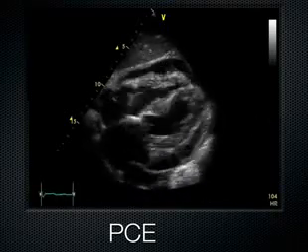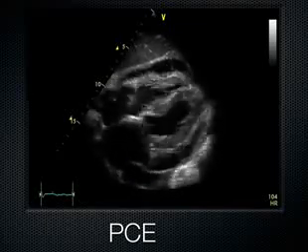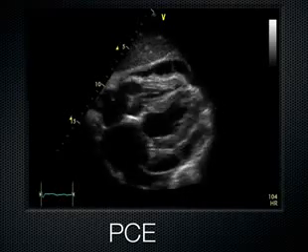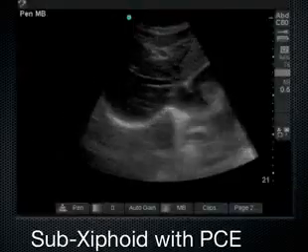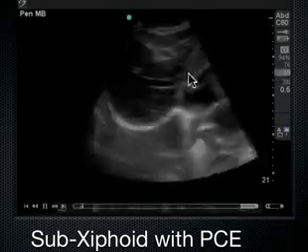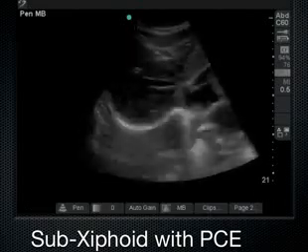So yeah, what's in there, I'm not sure. Could be some loculation, some fibrous material, could be some fat, but my eye is really trained to look for the pericardial effusion in that subxiphoid view. Here's another subxiphoid view showing another pericardial effusion, a couple centimeters there of a fluid stripe seen anteriorly. We can also see that fluid marching around posteriorly as well.